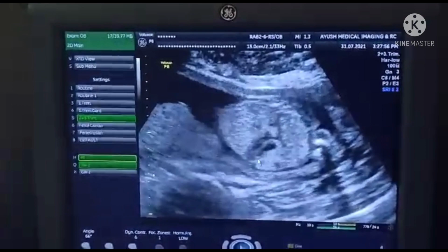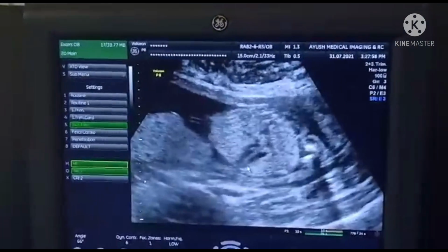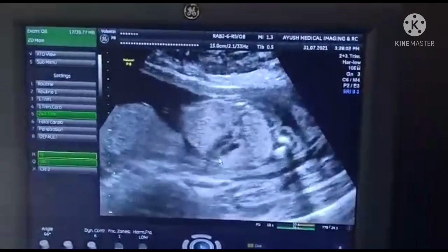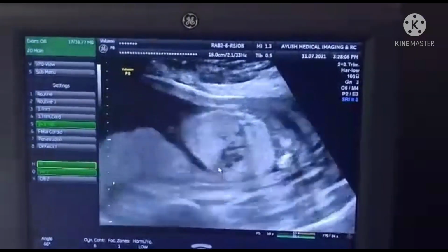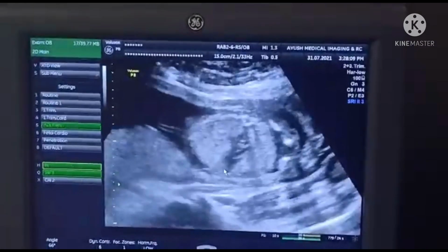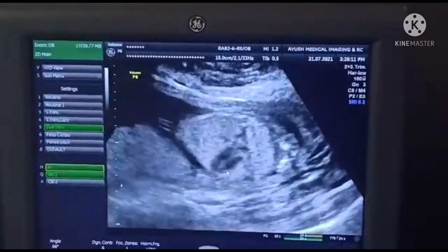Whenever we have these echogenic foci in the ventricles, we need to be very careful looking at things, and these echogenic foci are seen as early as in the early scans, like 12 weeks when we do a transvaginal scan.